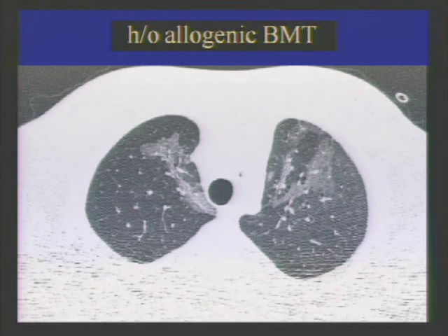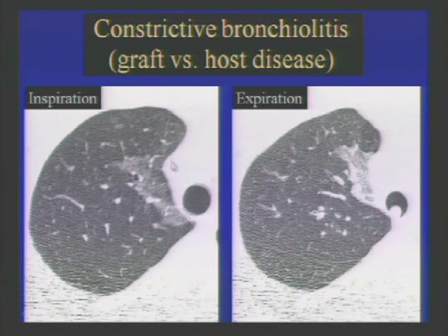When you see opaque and lucent lung, okay, well, it is sharply defined, but viral infections can sometimes be sharply demarcated like that. Because there's such a difference in opaque and lucent, we tend to think the opaque is abnormal. But this patient was exactly the same 6 months later, which would be unusual for viral infection or any other cause of ground glass to do that. On the expiration, you can see how the normal lung, which is this small sliver of lung, gets denser, and everything else stays about the same.